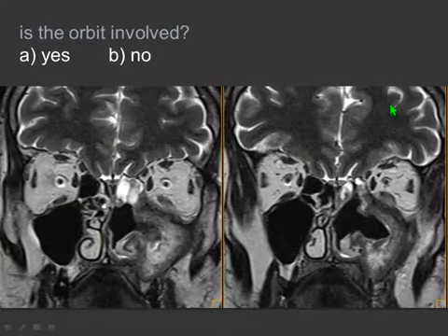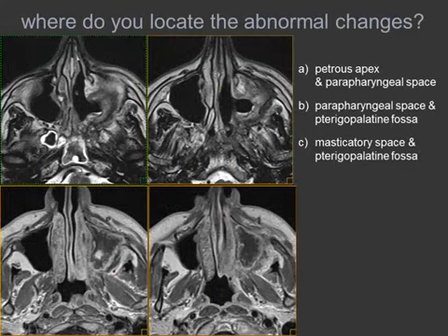I think that the better explanation in this case is that we are dealing with a condition where the masticatory space and the pterygopalatine fossa are abnormal. The abnormality, as you can see, is behind the posterior wall of the maxillary sinus.